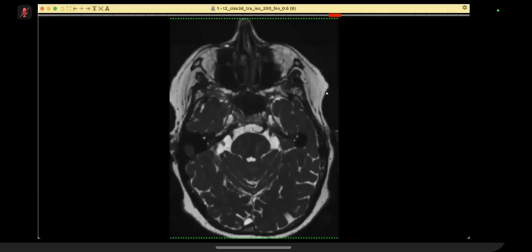What is your conclusion and how will you confirm it? I can see there is a vascular structure communicating the anterior to the posterior circulation, abutting and likely compressing the left trigeminal nerve at the Meckel's cave. I like to confirm this by MRI with contrast, MRA.